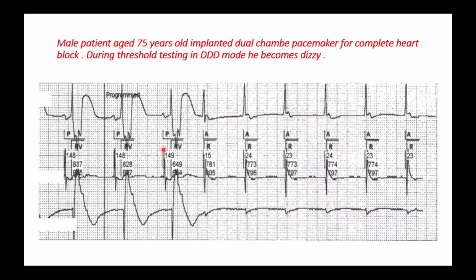While during atrial sensing, there is no such problem. So this is the definition of AV crosstalk, that the ventricle senses the atrial pacing. Interrogation during testing is very important. And in some machines, you have to choose dual EGM so that you can see the atrial EGM, the upper one, and the ventricular EGM, the one under.